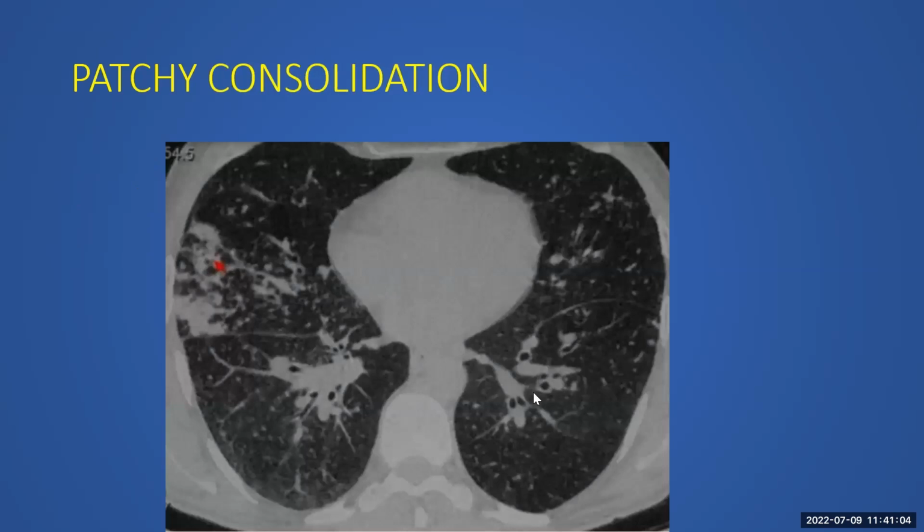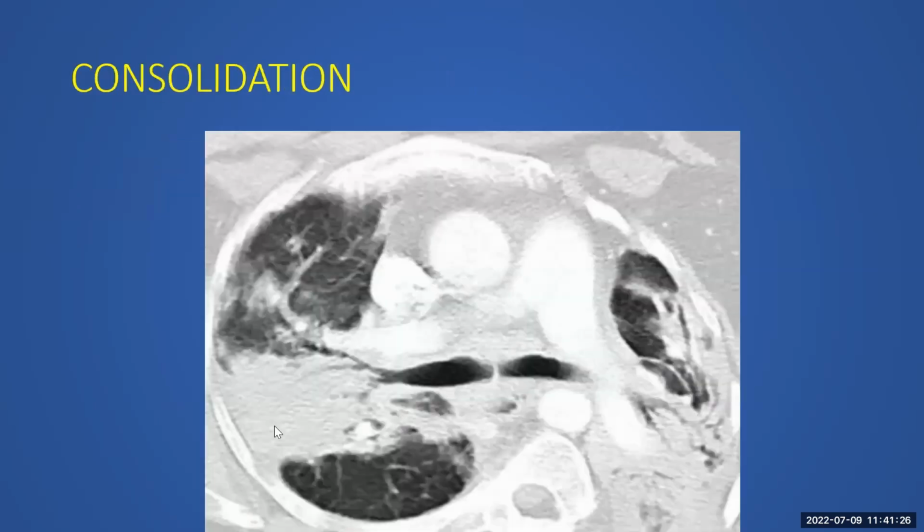But you can note that even along with these patchy areas of consolidation, there are small nodules. There are subpleural nodularity there, here. There is some interlobular septal thickening probably there, and some peribronchovascular septal thickening in this region. It looks a bit thickened than normal, along with patchy areas of consolidation. And this is frank consolidation itself involving the upper zones bilaterally. Again, a case of sarcoidosis.